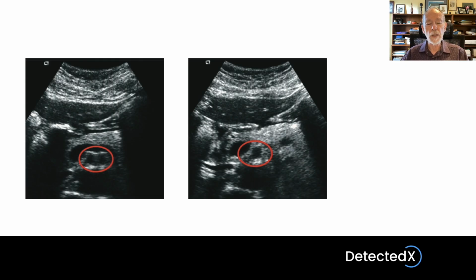The other place where it is quite commonly seen is when scanning the heart transthoracically, where the cartilage and muscles associated with the ribs can cause refraction of the beam in two different directions, causing a doubling of some structures within the heart. So this is a fairly uncommon, but nevertheless potentially quite deceptive artifact.